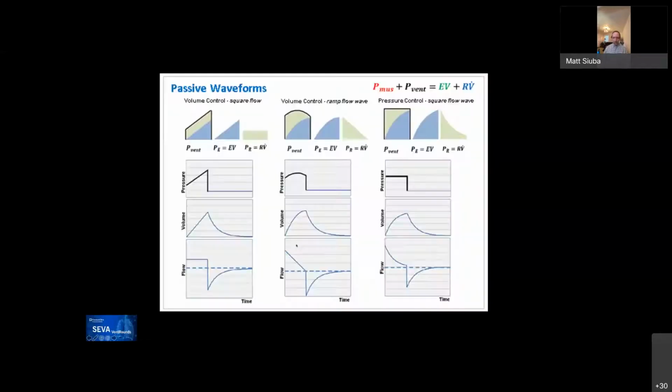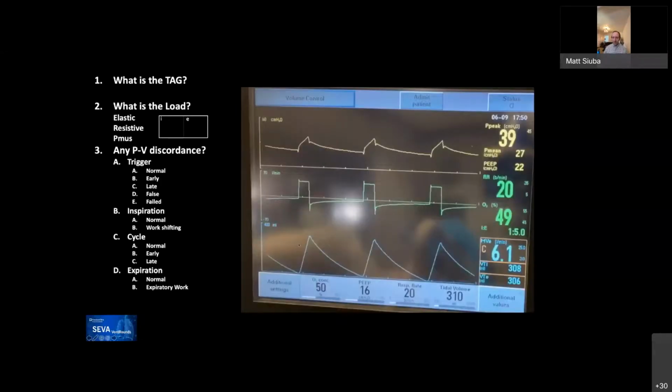All right, so here is another waveform. Since the poll's not working, we'll give you some time to interpret this. This is the case that I have, so I can talk about this one in great detail. We'll give you about a minute or two, and then we'll see if a fellow or somebody else wants to volunteer to walk us through this.